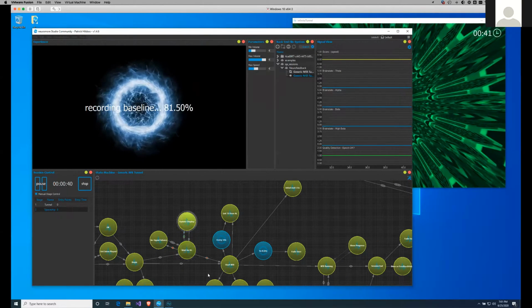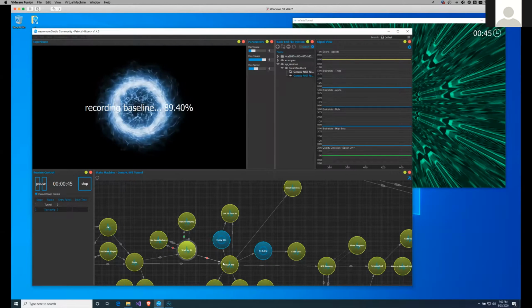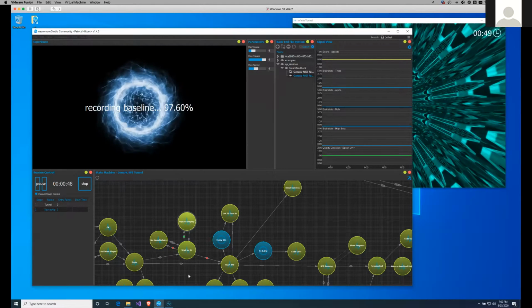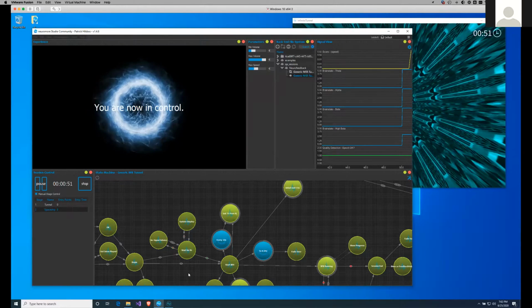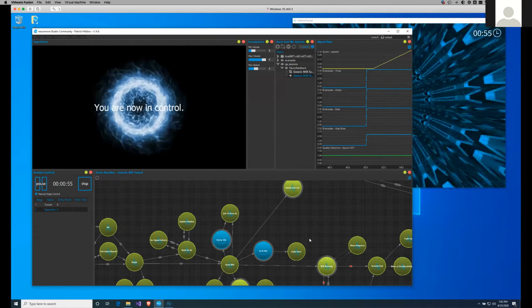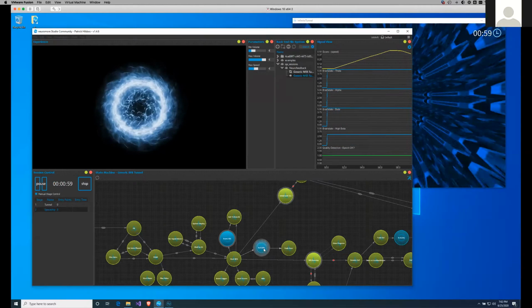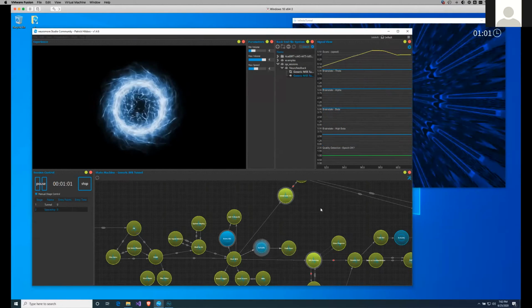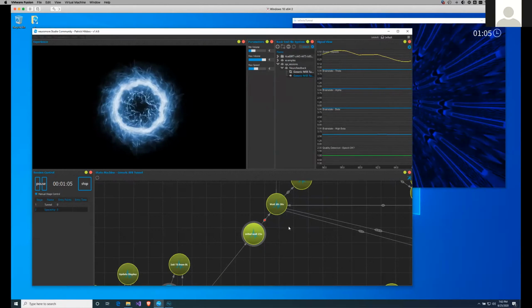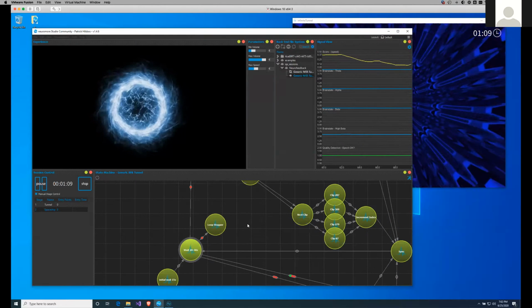Baseline. And the condition to move on to start neurofeedback is that the baseline is complete. And it happens now. Now we're here. Now there's also something interesting. You can see that the state machine can have multiple states being active simultaneously, with certain triggers and so on. And that also massively helps you to debug, see what's going on, and make the changes that you want to see.